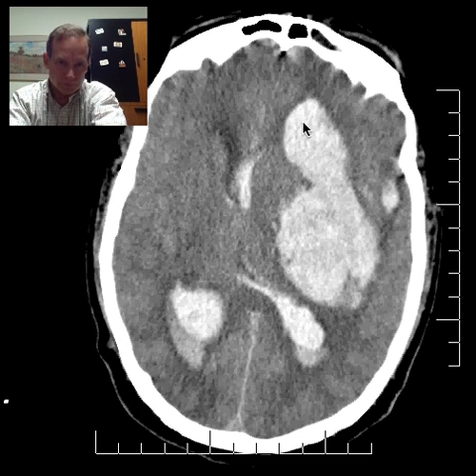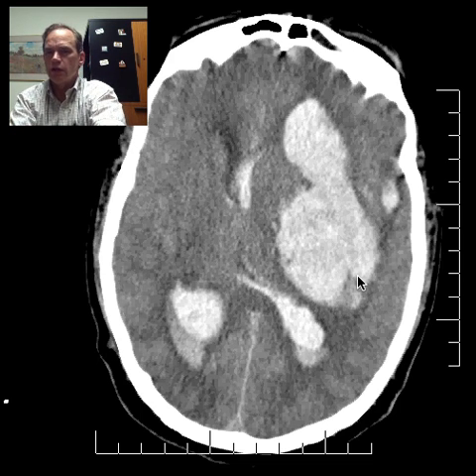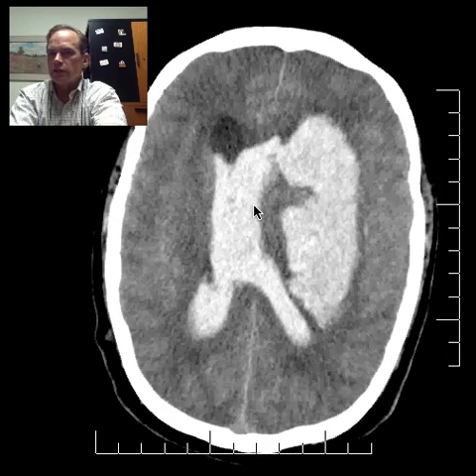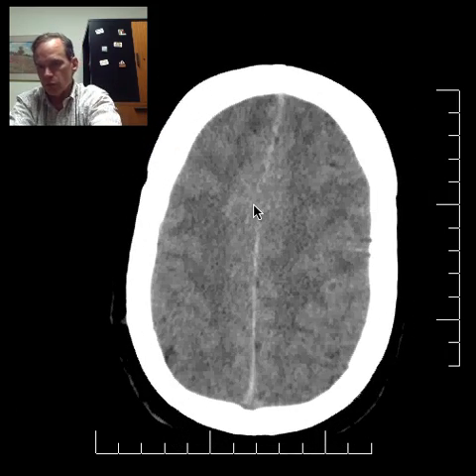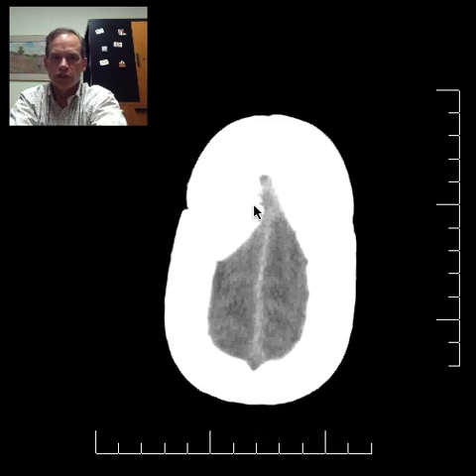It's actually quite remarkable when you have a hemorrhage like this, or a smaller one. When it heals, it can heal with almost no finding at all. Once in a while on an MRI you'll have some hemosiderin causing signal abnormality showing you where the line was, but they can heal quite well. This, I think, would be less likely because of the severity of compression that would probably be not only compressing the brain tissue itself, but impairing the ability of the cerebral vessels to perfuse the brain. So I wouldn't be surprised with this much mass effect that there's probably some degree of ischemia associated too.